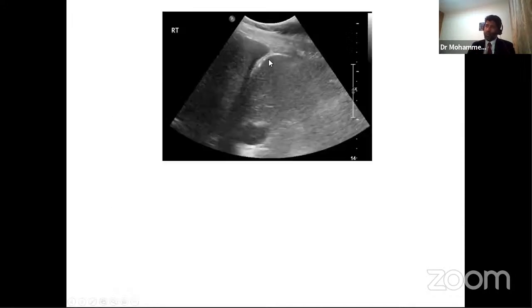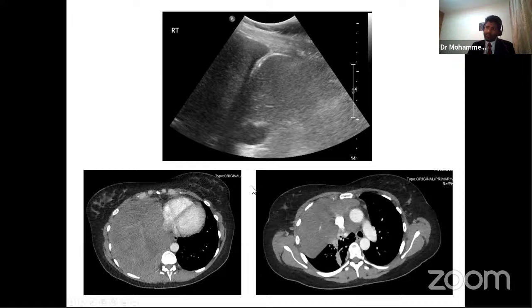And this patient went on to have a chest ultrasound. The chest ultrasound shows a hyperechoic area here. This is the diaphragm, this is the liver. Chest ultrasound is one of those imaging techniques, easy to learn, quick to adapt. It's all about looking at the descriptions and looking at the patterns, and looking at the patient.